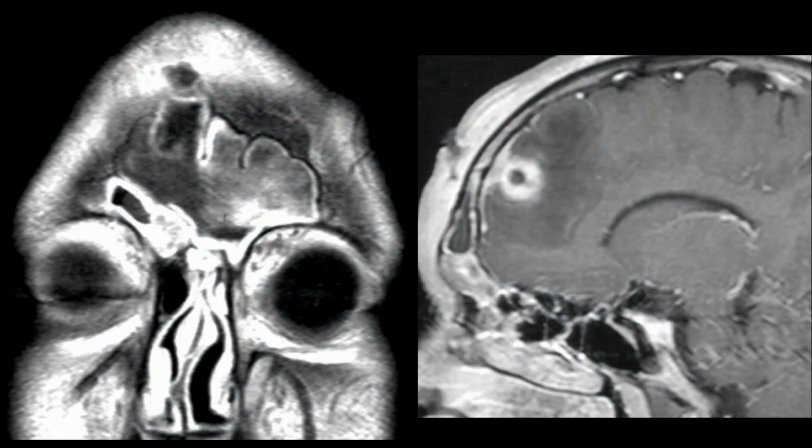Now, in a lot of patients who have sinus disease, they frequently start taking their medicine, and they're always told, keep taking your medicine until it's all gone. But the patients frequently feel better after a couple of days and stop, and they end up like this patient, where there's very bad frontal sinus disease. And this disease actually went anteriorly and caused what we often call Pott's puffy tumor, an acute onset of a subperiosteal abscess within the subcutaneous tissues in front of the frontal sinus. But this disease also went back intracranially. It caused an intracranial abscess.